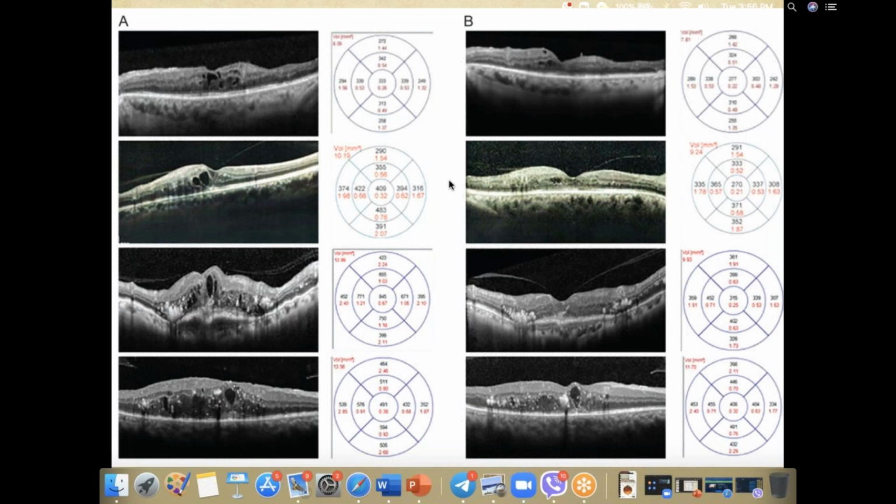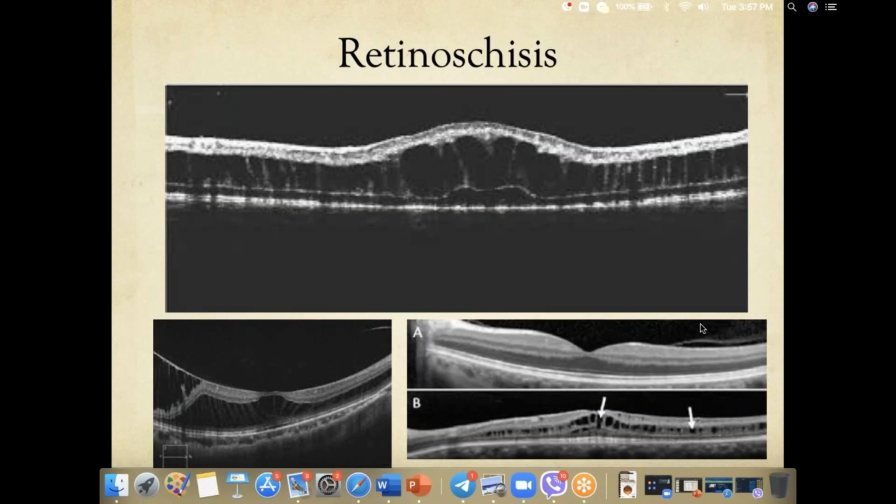So this retina will ultimately go into the same state again if not treated further, because when you take into consideration the macular volume, although here you see a decrease, the rest are still inflamed, and this part actually shows an increase in the edema. That's why macular volume is very, very important in determining the course of treatment, and not just relying on the central macular thickness. Fine.